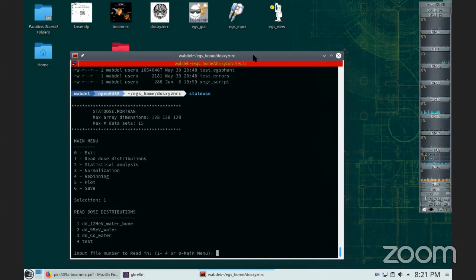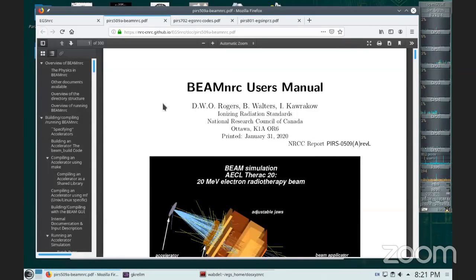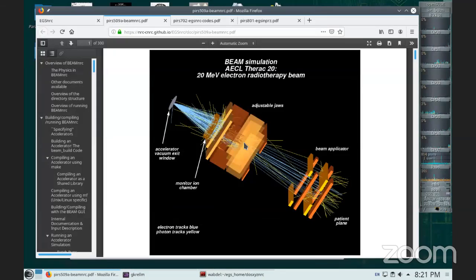So that's why we need to define a different geometry for different regions in the linear accelerator. If you have your browsers, this is the linear accelerator. You see this geometry is probably the same, but now we have these scattering foils. I think this is an electron beam. Scattering foils. I don't know what is here.